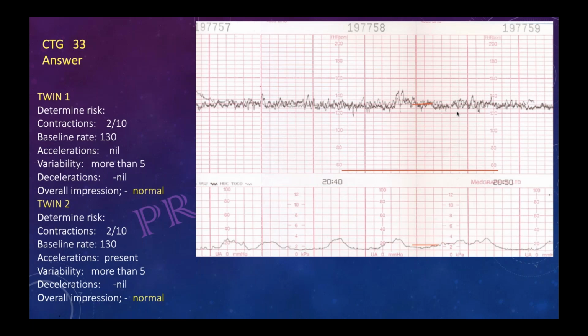But I put this type of trace just to give a visual impact, because this has come in the exam. That clear CTG I never had, only one I got, and it appears almost the same. I just want to give you a picture of how a twin CTG looks, because in part 3 it comes in the exam.